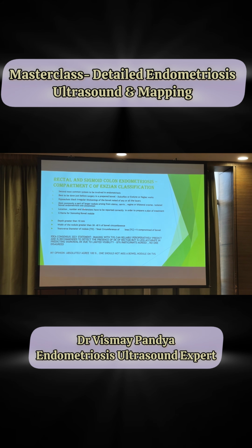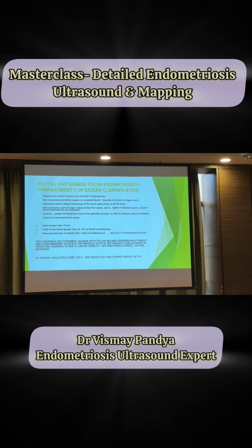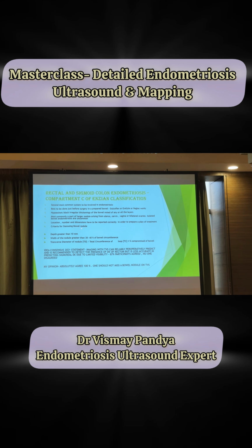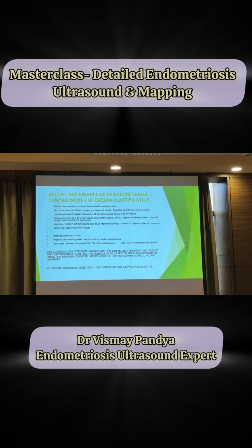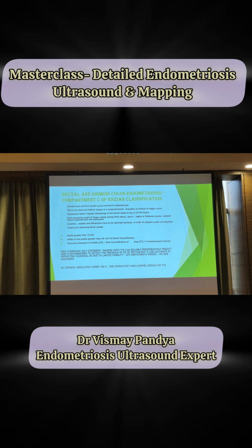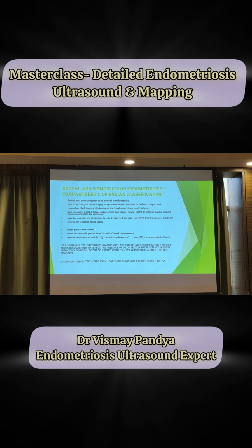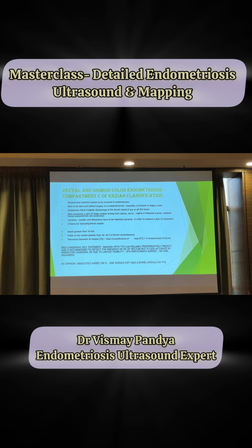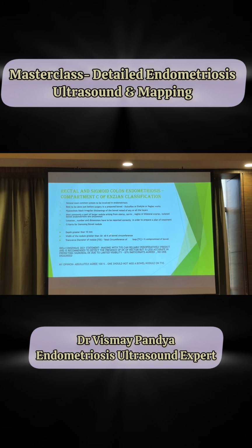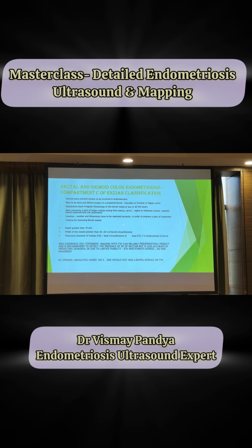Location, number, and dimensions have to be reported correctly in order to prepare a plan of treatment. Now, this is the criteria for something called a stenosing bowel nodule, meaning in what cases of bowel nodule would you require to do something very radical like resection and anastomosis. The rule is very simple. You do a transverse imaging of that nodule, and if the depth is greater than 10 millimeters, there is no second thinking. You have to resect that bowel. Of course, for 6, 7, 8 millimeters, that can be done under a discoid excision or even a deep rectal shaving will work for them.